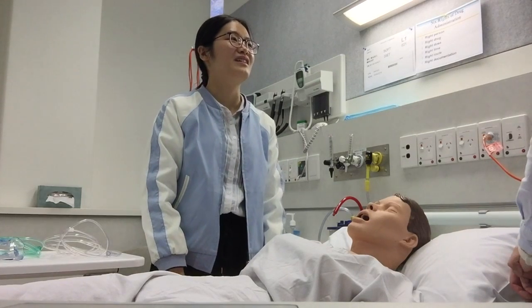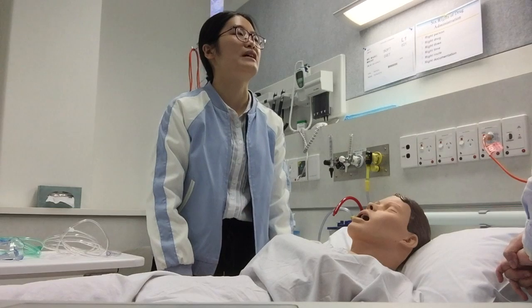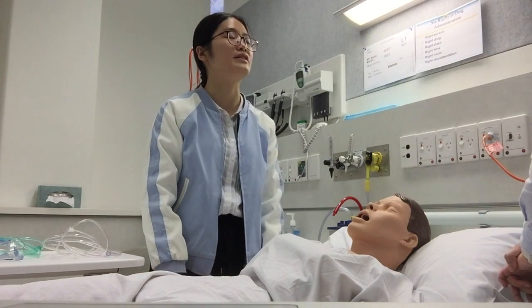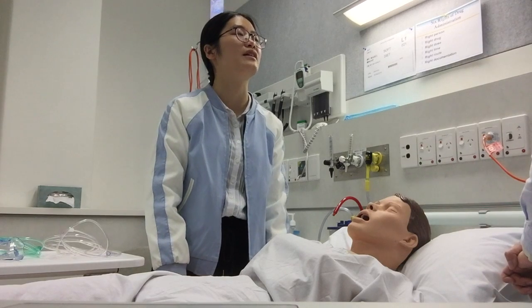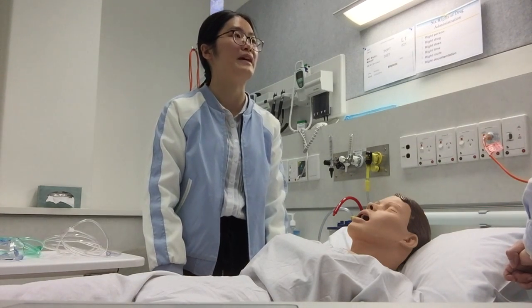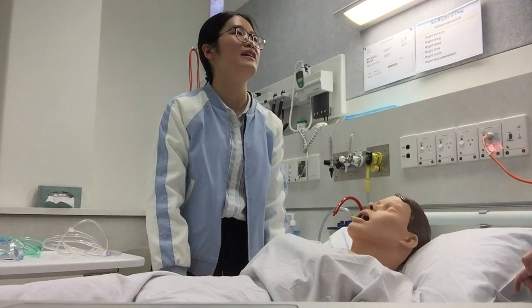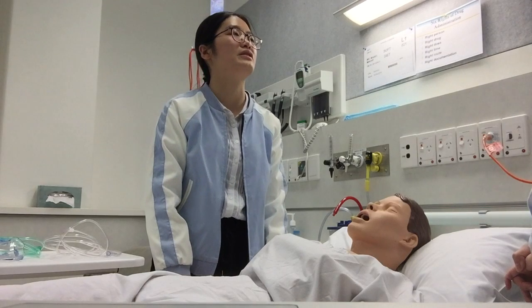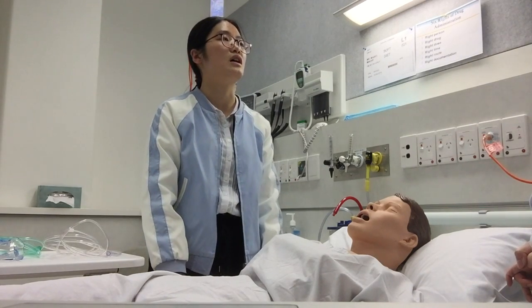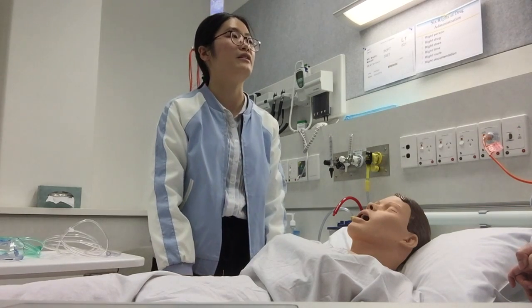Good. Today I'm going to teach you a skill. As nursing students, we all know that teaching a colleague is a very important role for us, because during the procedures we can exchange our information and experience of the placement, and it's very good for both of us. So today I'm going to teach you how to identify the differences between the oxygen delivery devices and their functions and features.